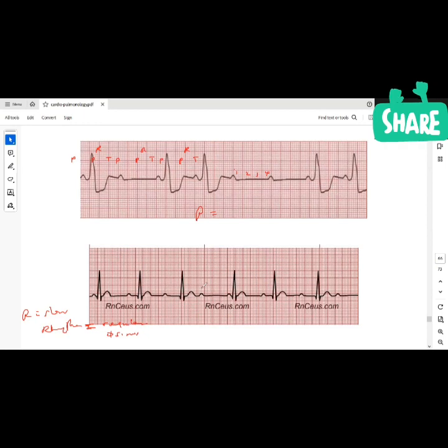This is straightforward. This one too has the same rate. They have almost the same rate as their corresponding RR interval. So basically, the distance between these two is going to be the same as the distance between these two. They all have the same rate, no matter what.